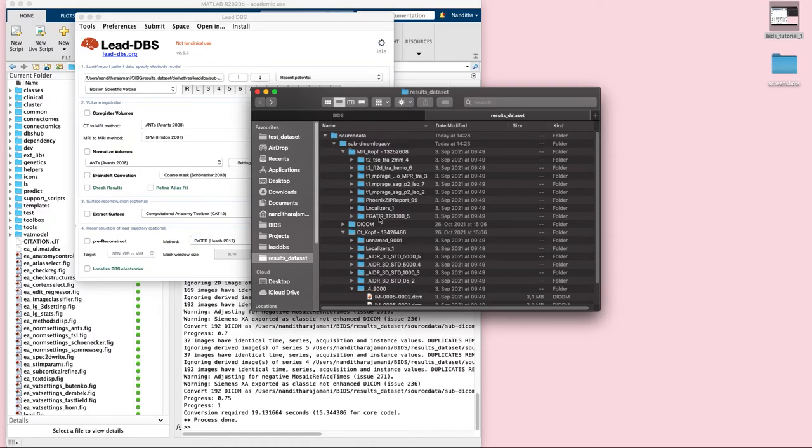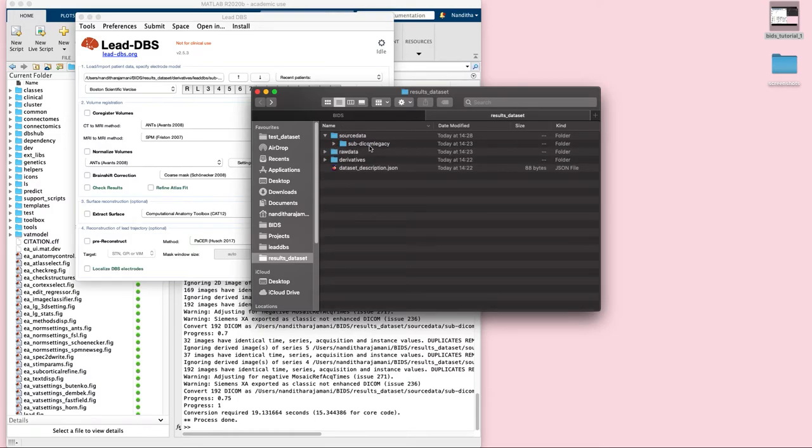This is largely untouched by the software tool itself, except for maybe a step where the DICOM files are converted to NIfTI. So if you run dcm2nii, for example, that should convert the DICOM files inside this subfolder into raw NIfTI files.